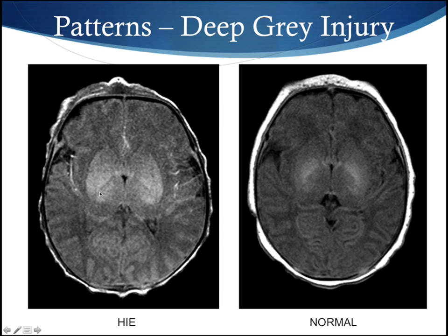For readers who do not see a large volume of these patients, it can be very difficult to appreciate the subtle change between normal and slightly abnormal. I find a good internal control is the unmyelinated cortex. The density of the putamen in the normal patient is relatively similar to that of the cortex. When you look at the HIE patient, you can see that the posterior putamen is significantly brighter than the adjacent cortex.